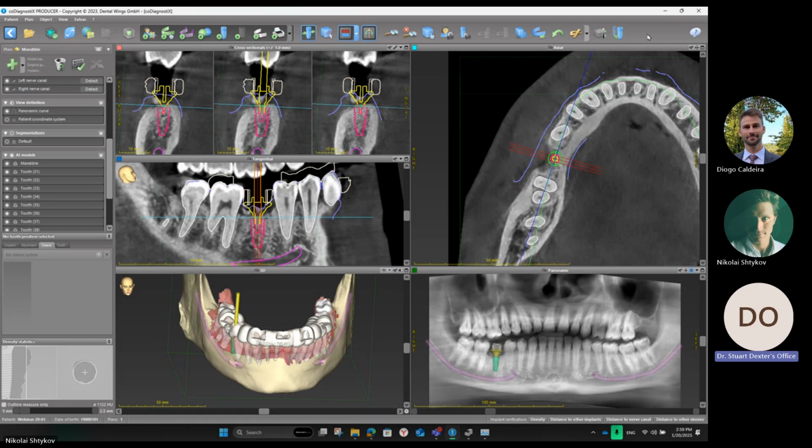Okay. And if you do use a different system other than Straumann, so far we've only used Straumann with this system, how does that affect your sleeve positioning? Are the other systems in this system, so that if you are going to use, I'll just throw Nobel out there because it's a commonly used system, does that accommodate their drill guide itself?